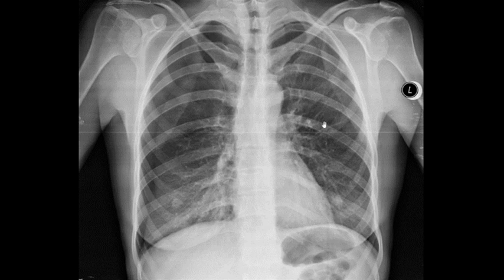So these are three interesting X-rays that show a simple, easily identifiable pneumothorax, and then also some complicated cases. In order to be proficient in analyzing this, here are the basics laid out. Only with quantity, with looking more and more at normal and at pathological X-rays with pneumothoraxes, after some period of time the eye gets accommodated, I would just say it like that, to these images, and the identification becomes easier and easier until you become a pro.